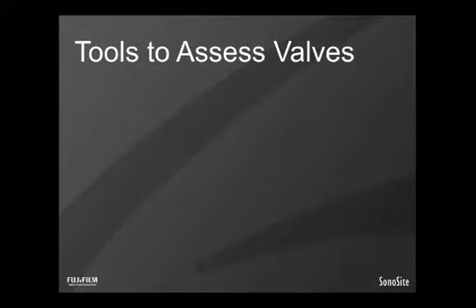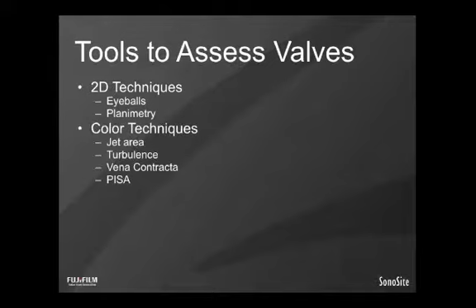So how do we assess valves? What tools do we have? Well, we have 2D techniques, which should be familiar to everybody, of course, through general inspection of the appearance of a valve, requiring your eyeballs, or in a more detailed fashion, planimetry in the diagnostic echo world.